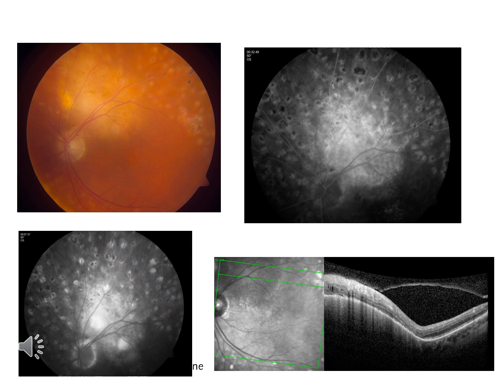This is another patient of Dr. Anthony Daniels. This patient has a choroidal hemangioma, and you can see it just supratemporal to the optic nerve. It has the typical light salmon-colored sub-RPE patch or lesion. The vessels leak and the tumor becomes hyperfluorescent as the angiogram continues. The OCT on the bottom right shows the elevation of the pigment epithelium.